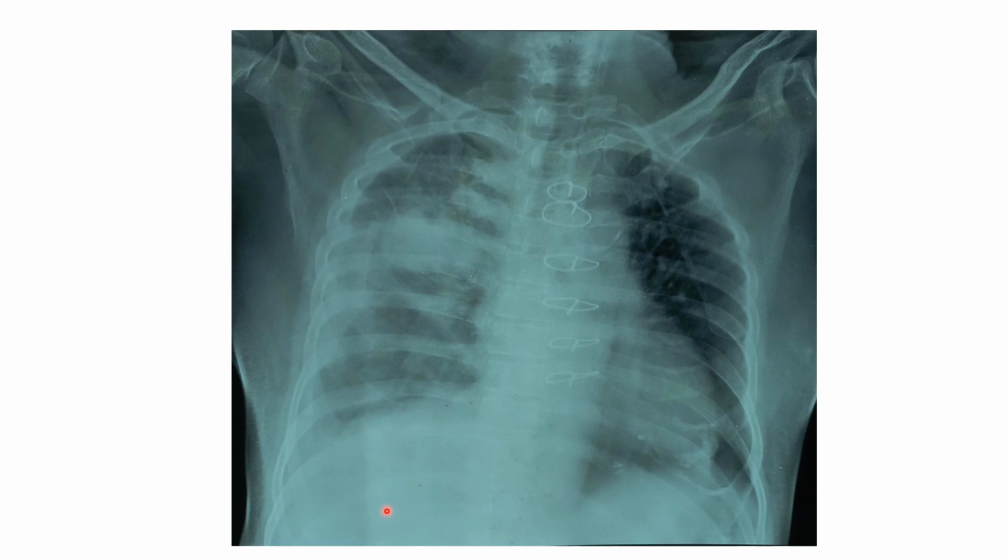So here again, this is a patient. Basically, the point here is that when you lie down, you can have a diffuse haziness in the hemithorax. This patient has a right-sided pleural effusion. There's a mass lesion up here. There is a right-sided pleural effusion. Here there is a blunting, but this diffuse haziness indicates that maybe this X-ray is taken in a supine position.